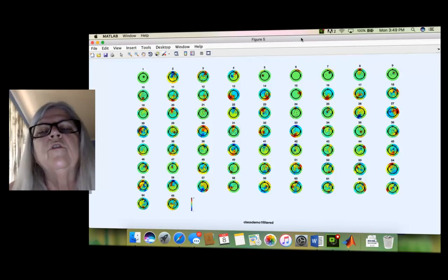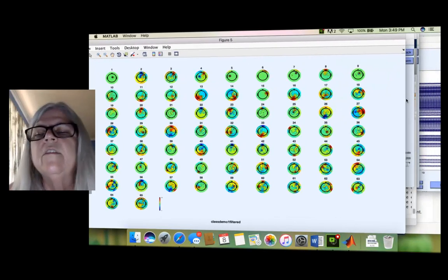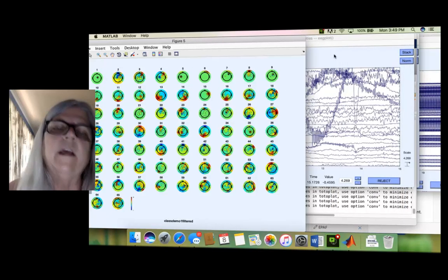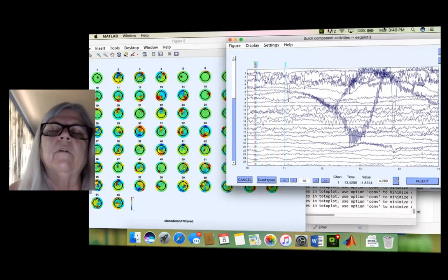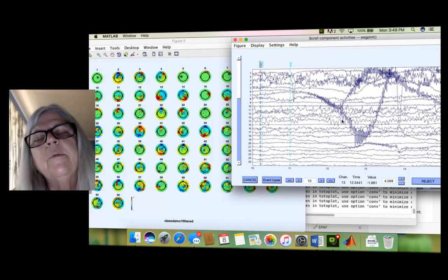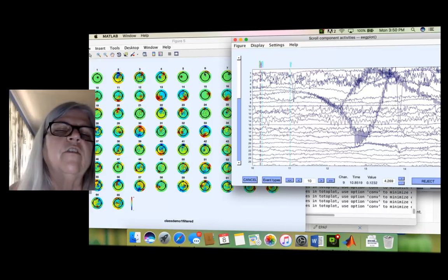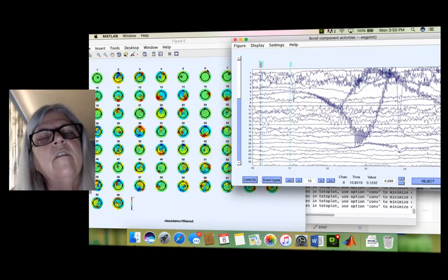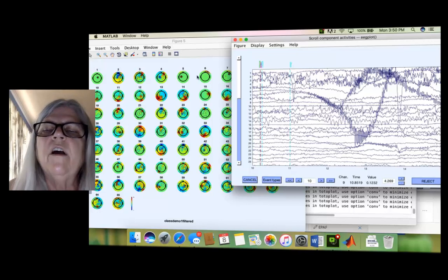So what you're going to do, or this is what I do, is simultaneously look at these figures and my time domain components. Right away, for example, if you look at channel 6, you see these crazy swings. You see this very atypical looking pattern. And if you look at channel 6 here on the two-dimensional topographic plotter where the power is, you can see the power there isn't even inside the head. This most likely indicates that you've got something on the right side of the face or in the right eye that's moving. Channel 5 is similar.